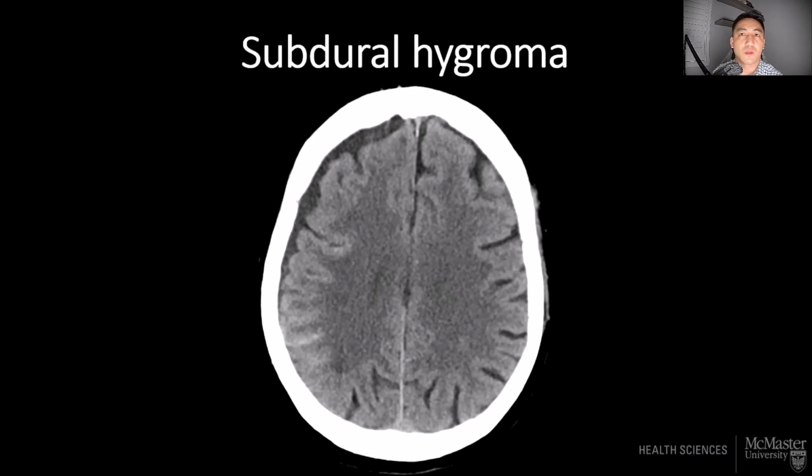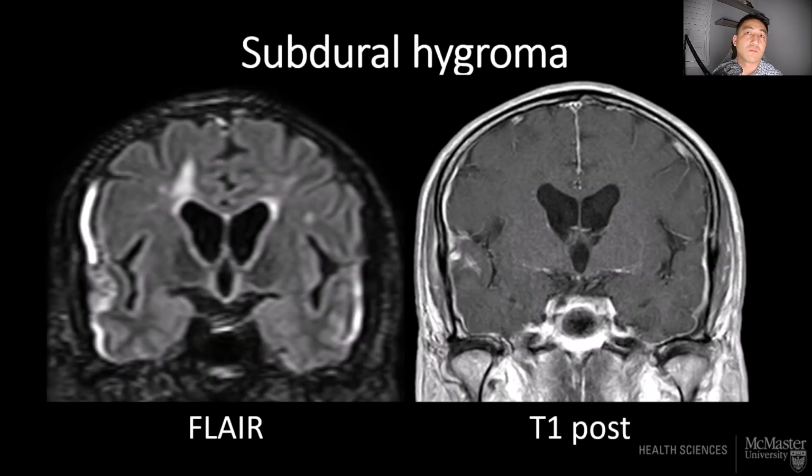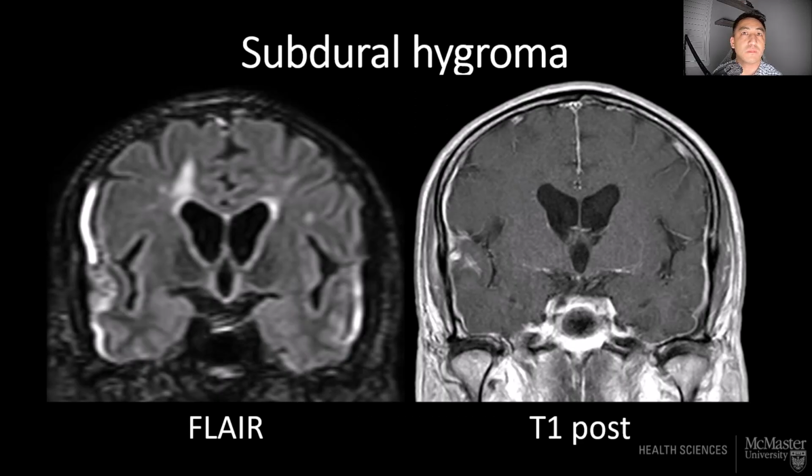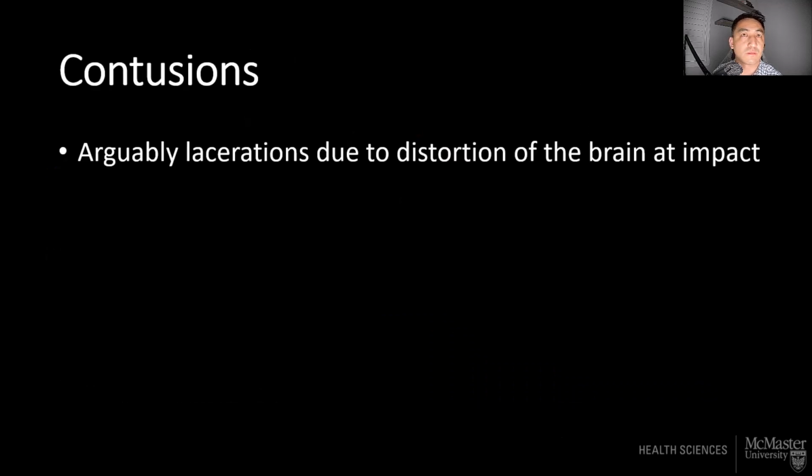These are subdural hygromas, which are common in head injuries. They don't grow. They cause minimal mass effect, if any, and they usually don't cause any problems. Even though they're supposed to be simple CSF collections, they can exhibit non-suppression on FLAIR. They're also associated with mild smooth pachymeningeal enhancement.